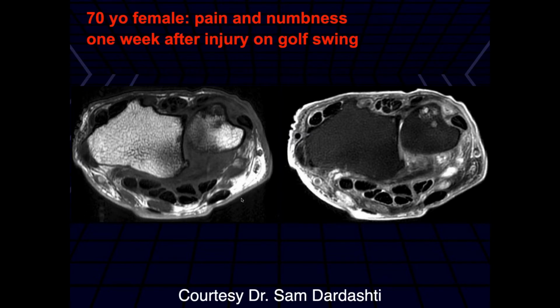Okay, 70-year-old female, pain and numbness 1 week after injury on a golf swing. Okay. Well, if you go out and exercise, you injure yourself. If you don't exercise, your joints fall apart.